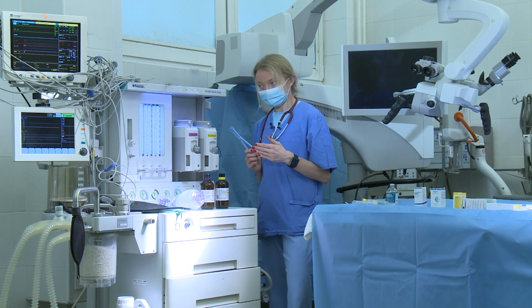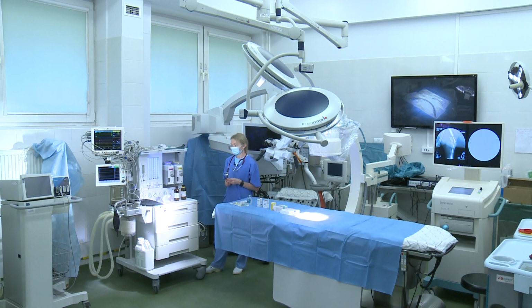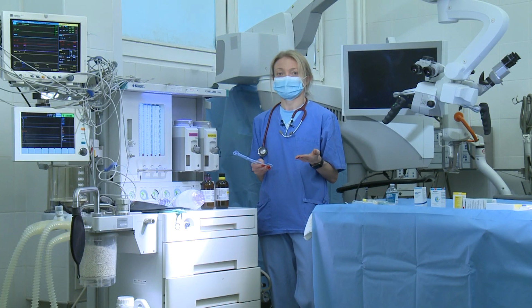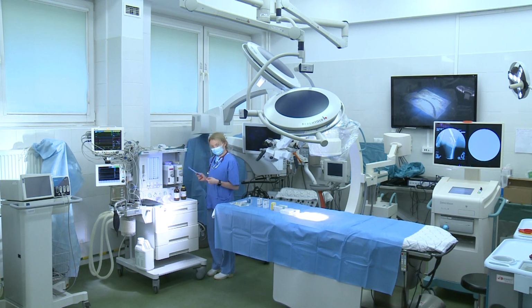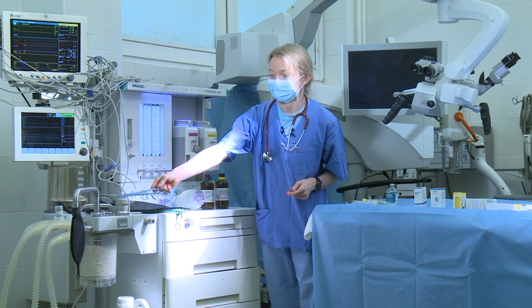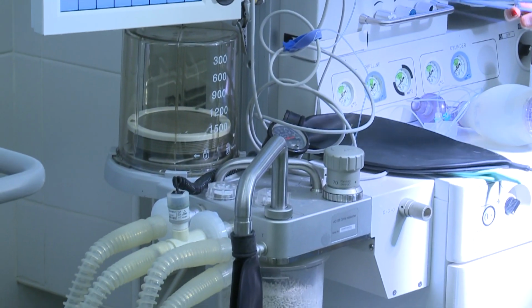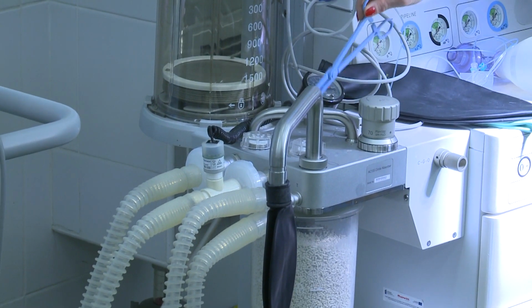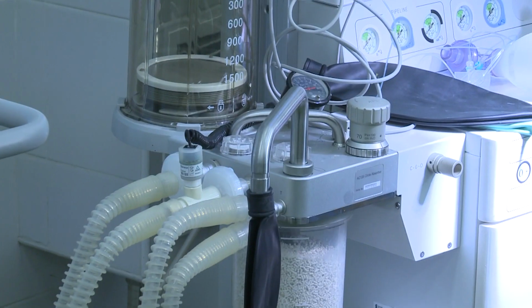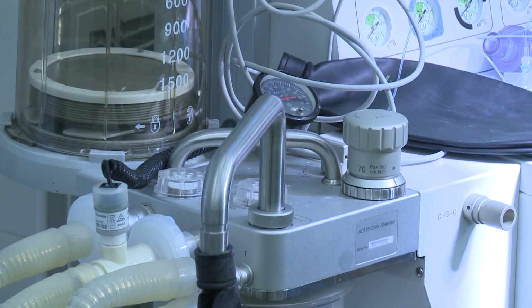Because on this type of machine, we are able to anesthetize patients from about 100 grams body weight up to 200 kilograms. You can ask me at this point what we are going to do with horses or with cattle. We have special anesthesia machines dedicated for horses and for large animals. The difference is only the size of the airbag and of the breathing system, and also the diameter of the valves and of the pipes. But the elements of the machine dedicated for large animals are absolutely the same.